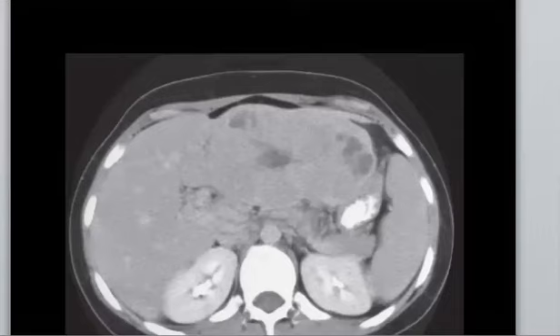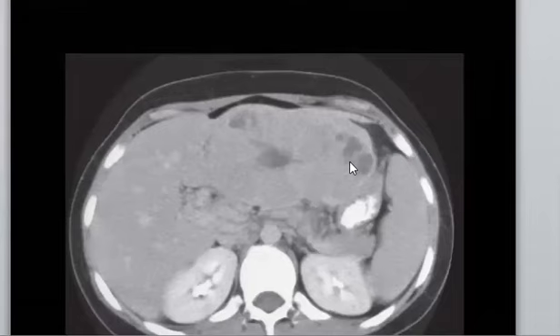Oh, okay, so the liver is non-cirrhotic, yes. In this case, one of the important tips: when you don't find liver cirrhosis, and you find a large lesion with a central scar, and also a younger age. Take care in the MCQ, they like to mislead you with this information, because always when we mention HCC, we think the background should be cirrhotic, and also the age maybe is not okay. So this patient with fibrolamellar HCC comes at a younger age, and the liver is not cirrhotic.